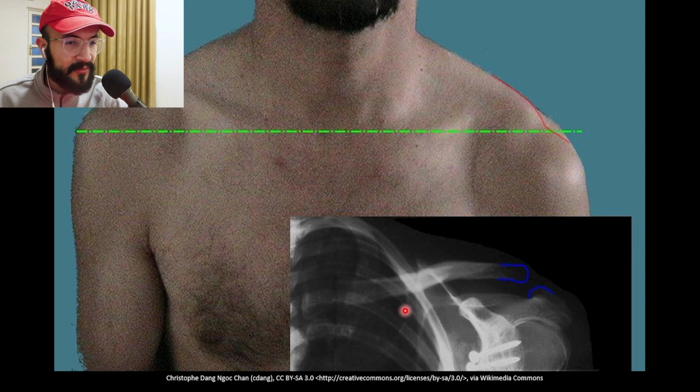So as we can see, we have an AP clavicle that you can see right here for this patient. And this patient's left shoulder is dropping, as you can see, identified by this line. So the right shoulder is higher than the left shoulder, meaning there is some problem with the left shoulder. If we assess the X-ray, we start with the bones. Starting with the humerus here, we can see that the humerus is normal, the clavicle is normal, but the glenoid is fixated due to some type of fracture before. And then the coracoid, the acromion, and the scapula all look normal.